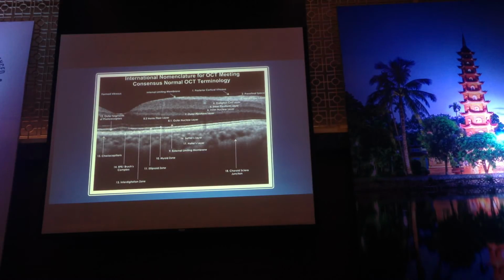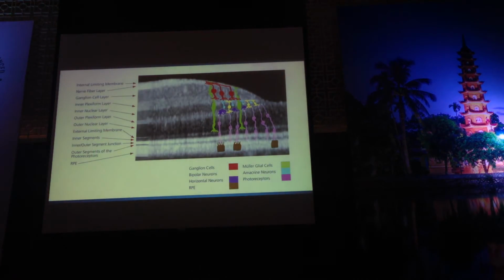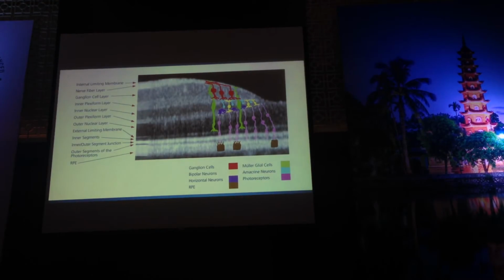So with an OCT strip, the two-dimensional cross-section scan, you can have these 18 landmarks for interpretation. But you cannot integrate all 18 landmarks within one strip. Sometimes in some strips you probably miss some. It depends on the light which shines through the retinal tissue, and it can vary a little bit. Here, we correspond all those layers with the cells and the structures of the retina.